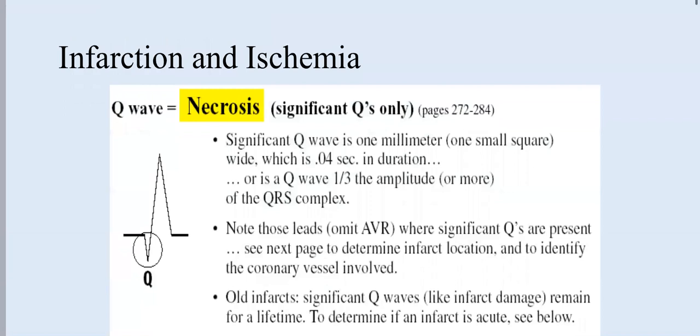Okay, Q waves. Q waves mean an infarction pattern. Q wave means completed infarction. Q wave means cavity, so the electric signal is going away from that cavity, okay? So Q wave is hateful. Cardiologists don't like it, and they feel disappointed when they get Q waves, because it means that there is completed infarction, completed necrosis, and probably it's too late to salvage the myocardium.